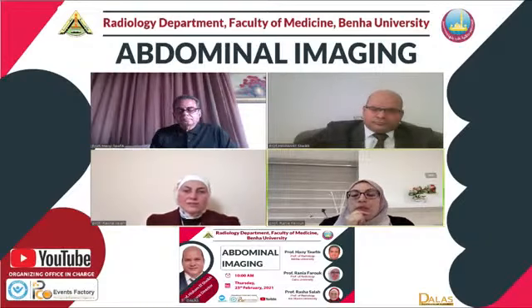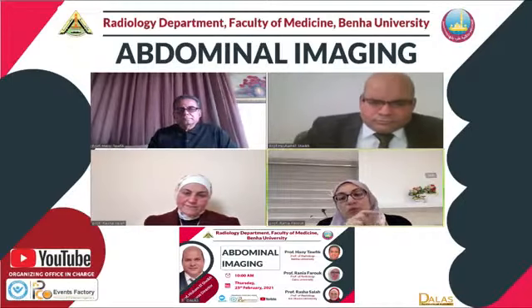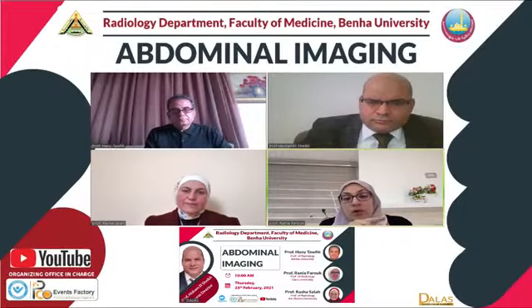انا بس ريكومند فور يو ان انت لو هتعملي كده خدي الكاتس بتاعت الانال سفنكتر وانت بعد الصبغه على طول، لان هي بتبان كويس قوي، والانترنال سفنكتر بتبقى انهانسنج. ده حقيقي ده حقيقي. الانترنال سفنكتر يعني لو هو لو ابتدي بالانال سفنكتر. تمام.